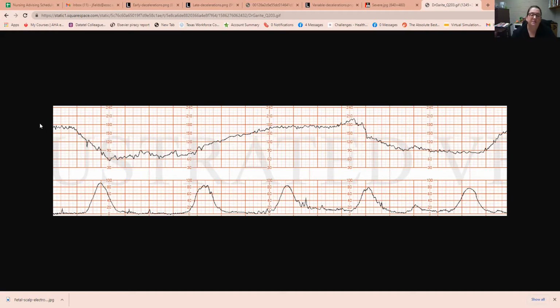So these are the ones, and I've seen patients do this a few times through labor, but like several hours apart, and you're just kind of waiting to see if it happens again. These are kind of stressful labors, but this is still not a guaranteed C-section. If it's staying down and it's not coming up, they're prepping for C-section, because I've seen them stay down, and then continue to go down and stop. So if it doesn't come up, you're prepping for C-section. When it recovers, then let's wait and see a little bit.